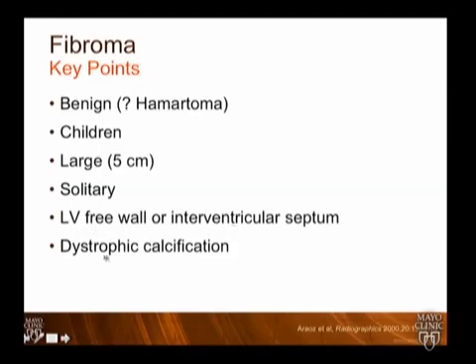And it typically has dystrophic calcification. It was kind of hard to see on that image. It was kind of overgained. But those are the major differences in differentiating the fibroma from the rhabdomyoma.